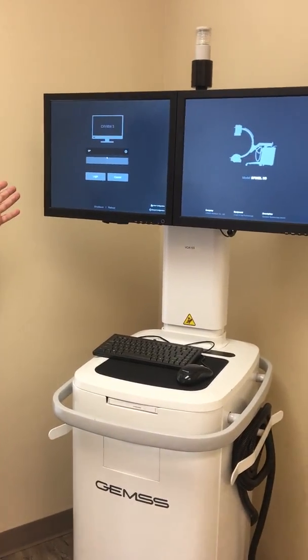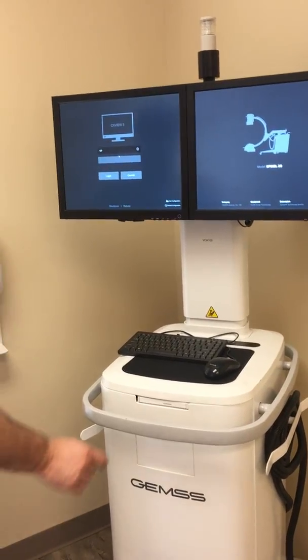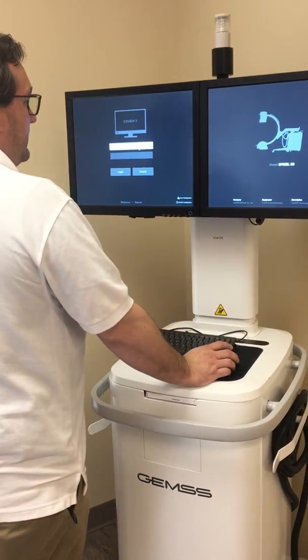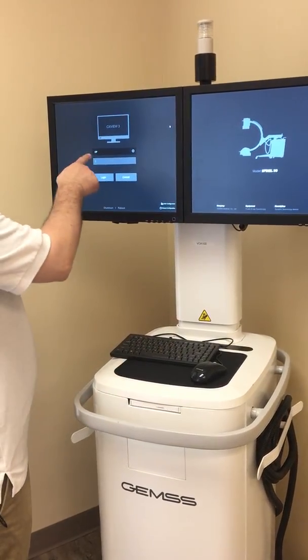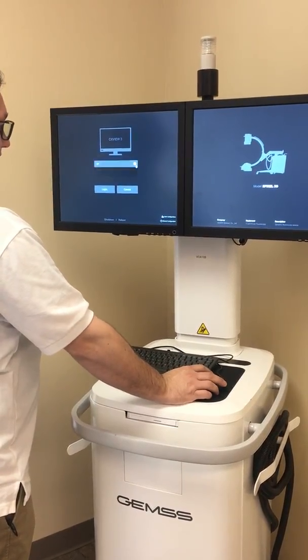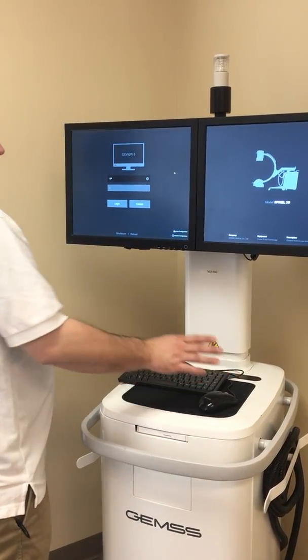So this is CXView3, that's your acquisition software. This is what you're gonna see, all right? So to log in, we've removed the password. So you're gonna log into the OP mode. There's also an admin mode that you're not gonna have access to.